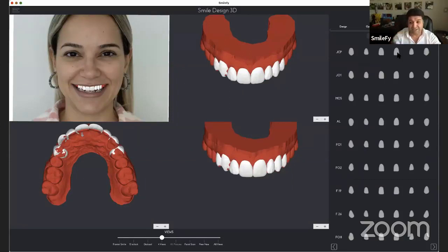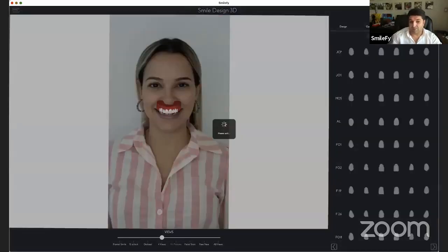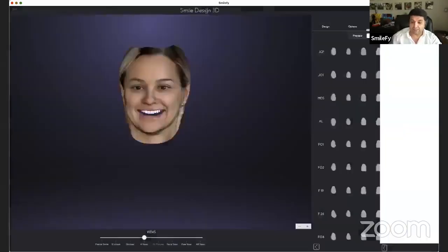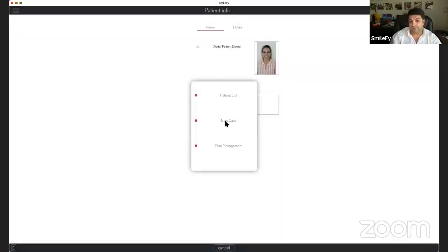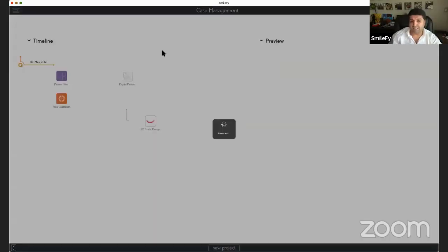You saw I just selected different centrals, and I have two versions of my mockup, which I'm going to export, and I'm going to create two versions of my mockup without the huge communication issue with everybody involved. So I own my project, and I can easily create this design.